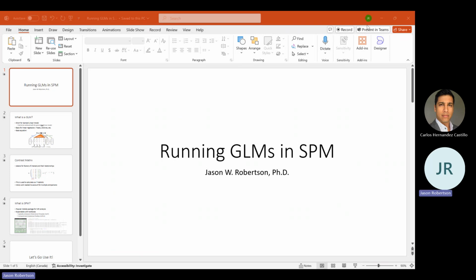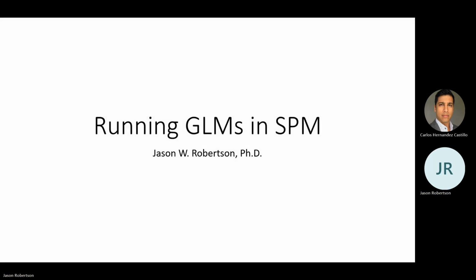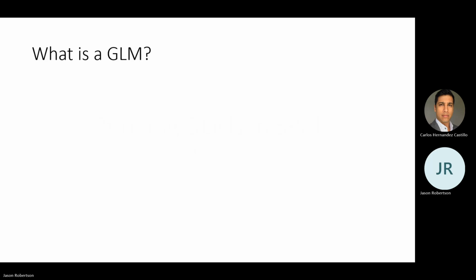All right. Now I'm going to launch desktop so that I can go into it later. All right. Yeah, should be.